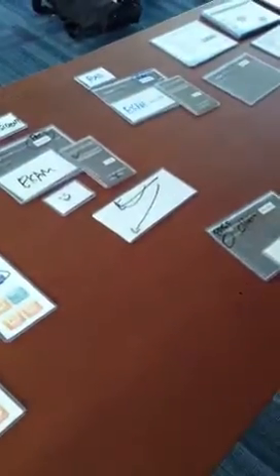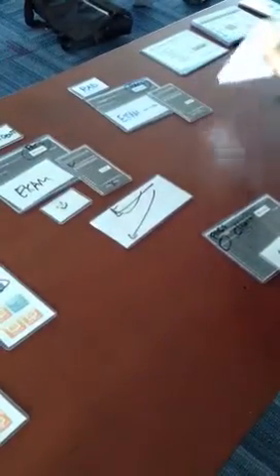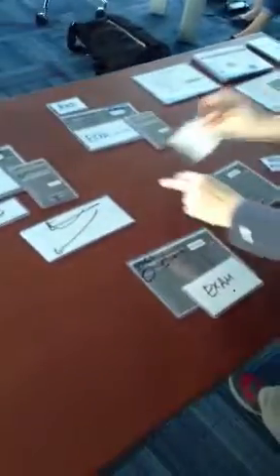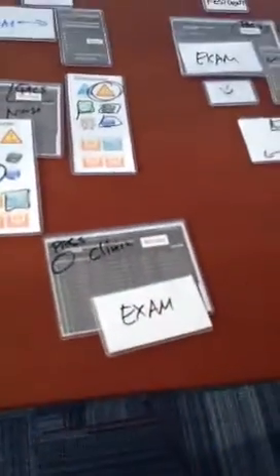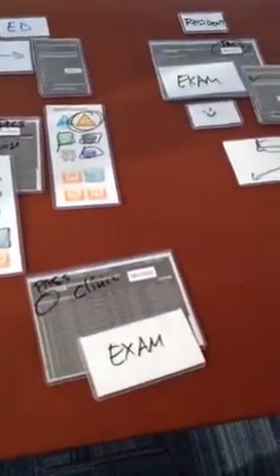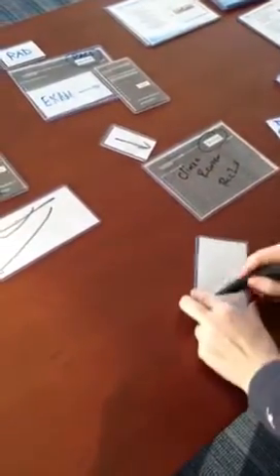Now the faculty person may think, well, this is a teaching opportunity, so what I'd really like is when I notice this discrepancy, I would also like that to go to a clinical follow-up work list. And instead of on the ER side, this clinical review would be for residents. So all of a sudden you have a clinical work list where you can launch the exams for the residents.